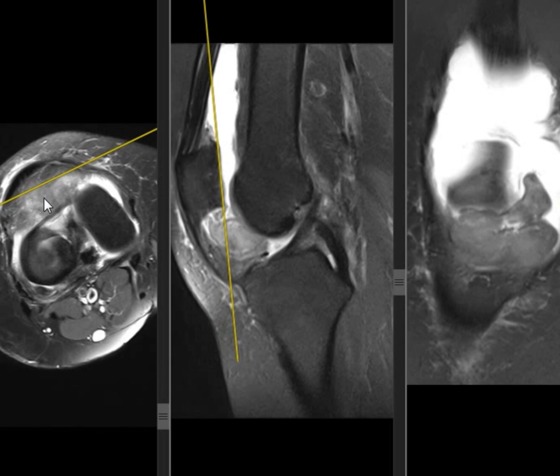Everyone went quiet. We reached the differential diagnosis, that's right. Pigmented villonodular synovitis, PVNS. PVNS should appear as what? It should have blood content. Does this have a signal of blood? No. Okay. That first one, ganglion cyst. By the name, by definition, it's a cyst. Is this a cyst? No.